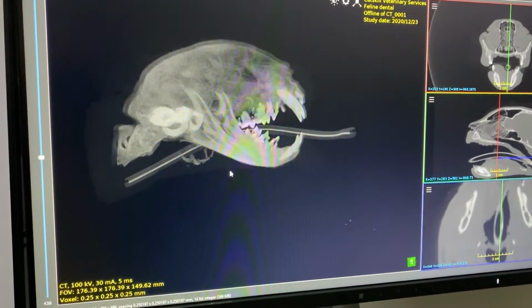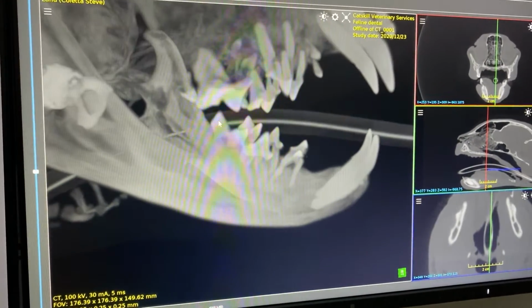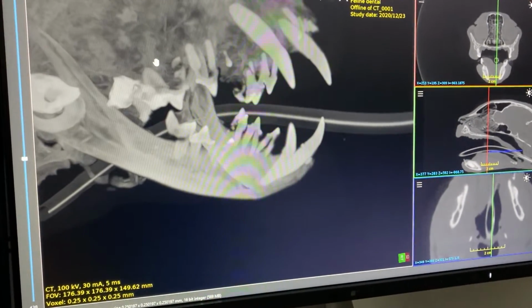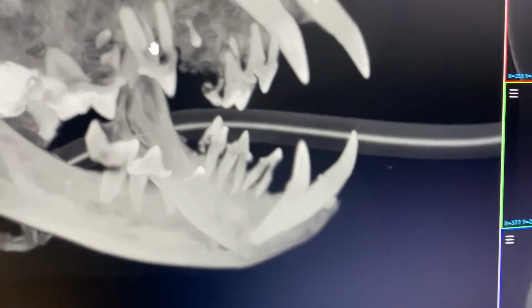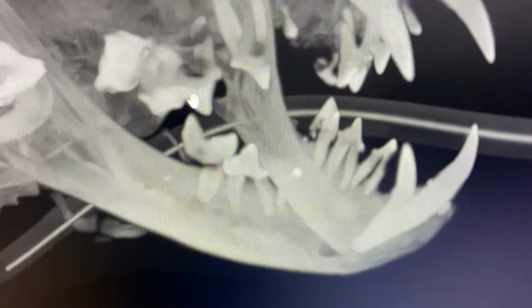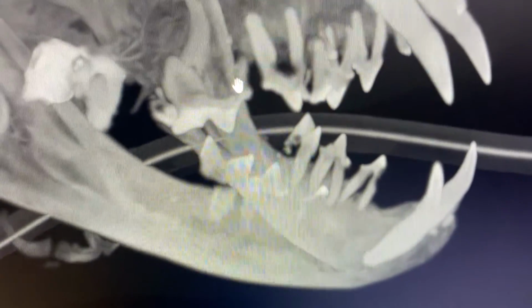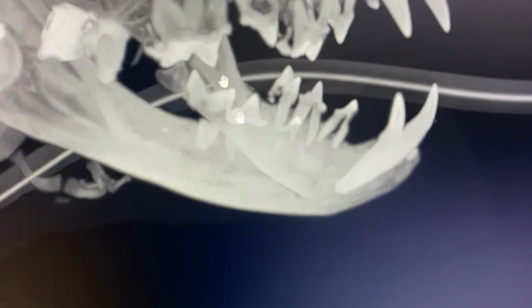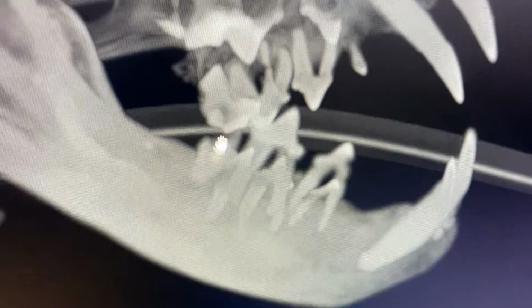And so now if I zoom in on this patient's teeth, you can see here that there's root destruction. If you see here, there's actually destroyed root here, and the same here, part of the root is missing. Maybe you'll see there's a hole right here on that root, which you cannot see from the outside. Again, disease damaged root. This tooth right here is also missing part of the root, which is actually broken off and in the jaw.